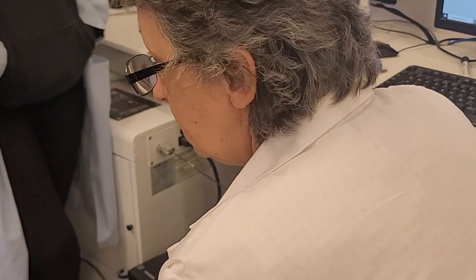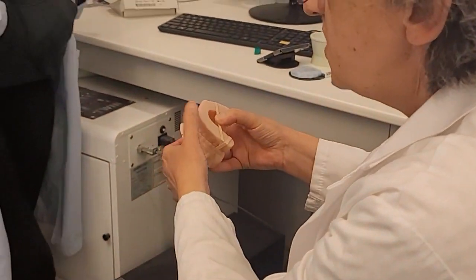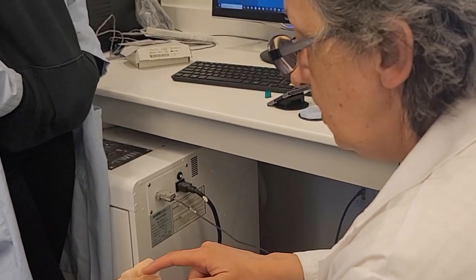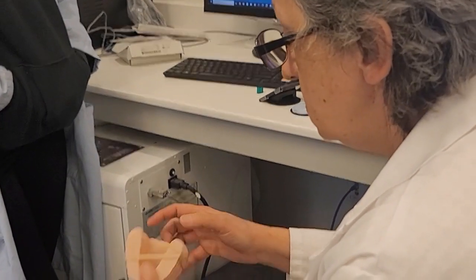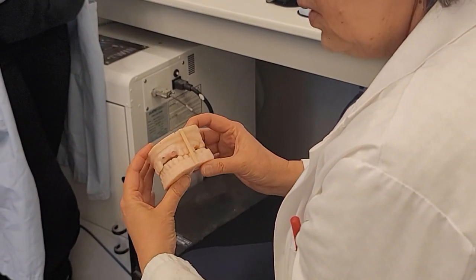When I tie that up with the rubber band, I want to make sure that I don't put too much pressure on the anterior and lift it from the back. So I'm always looking at the back teeth to touch, and it looks to me that it's pretty accurate the way it's put together, okay?